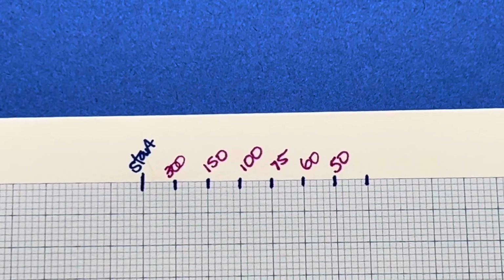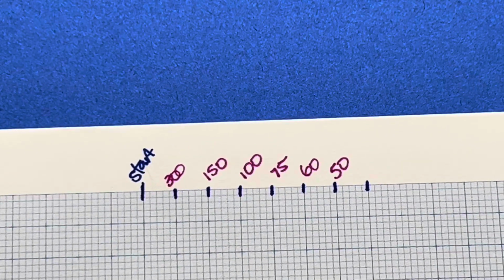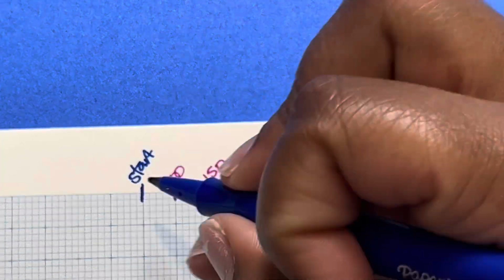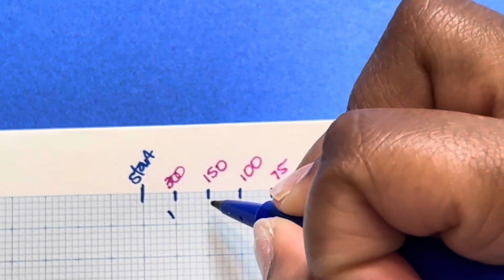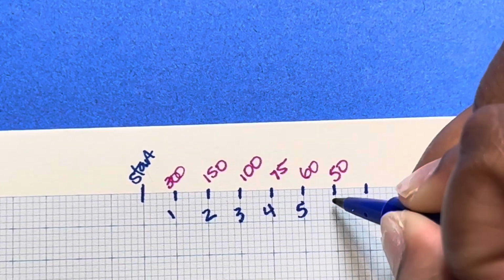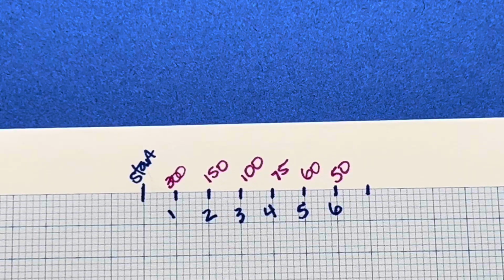Okay, so I have each of the large boxes calculated out for you so that you understand how many numbers. Let me go ahead and write it. So this is 1, 2, 3, 4, 5, 6. Okay, so each large box equals something.